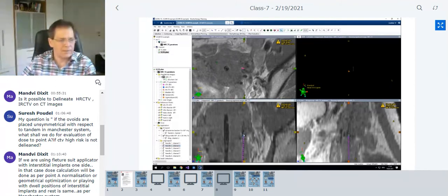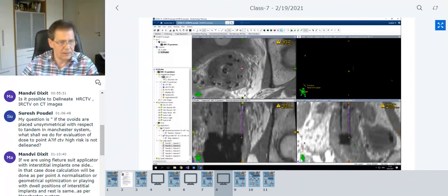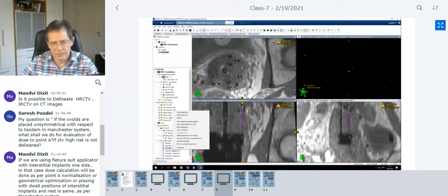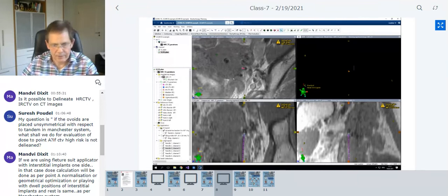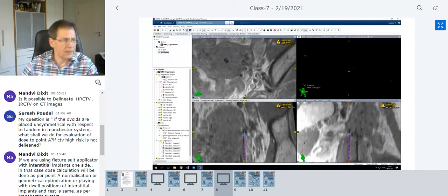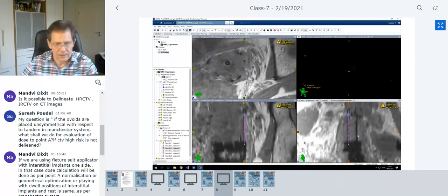So this is actually the other needle. The tip is here. I modify this position slightly. I'll look in the other plane. That looks quite good. And I go to the next needle. This is probably a little bit more up here. Again, I can always rotate my home data set to look into the needle itself here. And then I see that it quite nicely fits with my images.